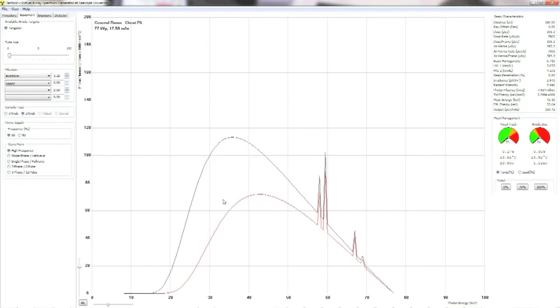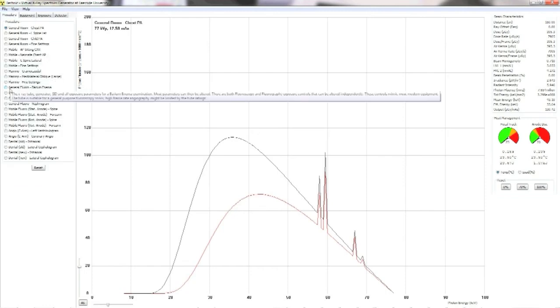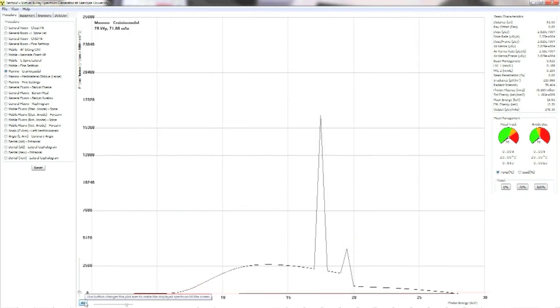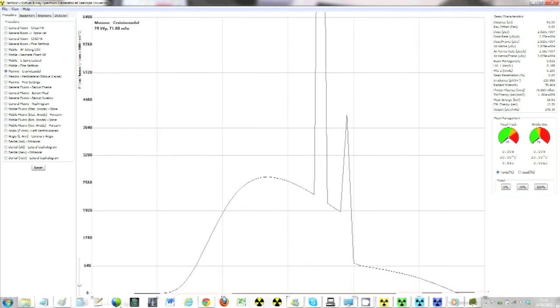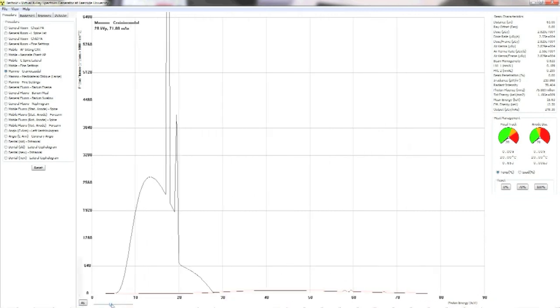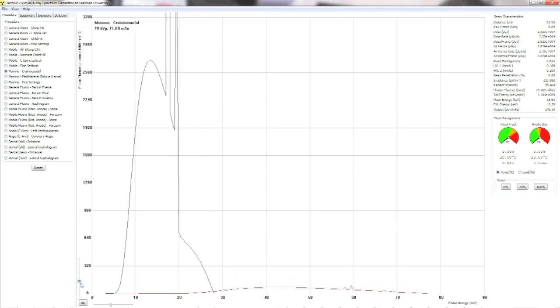These educators approached us with a request for a more detailed console with more features. We thought about incorporating this with Projection VR, but decided it would add complication for the novice student and decided instead to write a separate program. We're glad we did, because this allowed us to model much more than one single piece of equipment. We call this new program Technic VR.